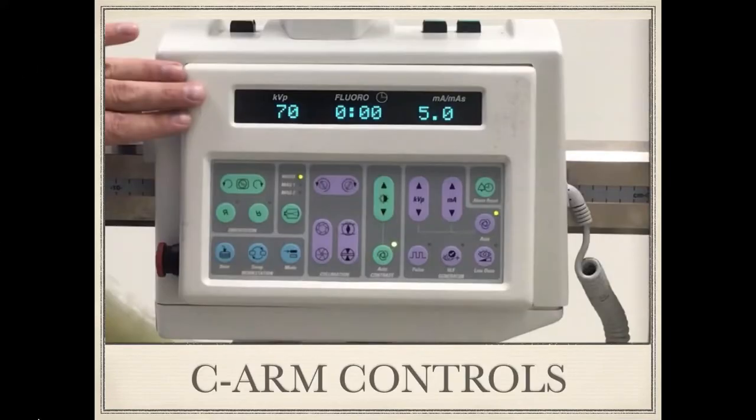Okay, now let's move to the next section, which is looking at the C-arm controls. As you can see, the buttons are housed in different compartments, and this is to group together buttons which perform similar functions. Let's look at the left top corner, which I'm highlighting now. These buttons are mainly to do with the rotation and the orientation of the image as you see it on the screen.